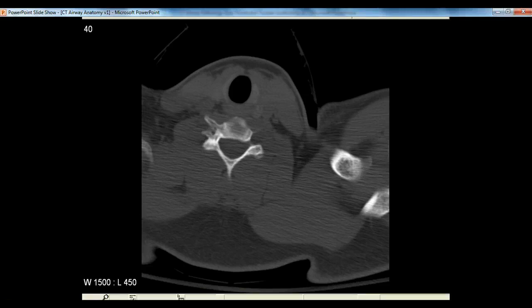And because of that solid ring of the cricoid right there below it, with the cricoid cartilage extending superiorly, almost forming a backside to the airway there, if you get in there, you can go through and through, but it's a little harder because of that cricoid cartilage in the back. It's giving you protection in the back and making sure you're in the right space. So that makes that structure a very important one in terms of airway management, and one that you should know well. So what we want to do now is go a little bit further down the airway.